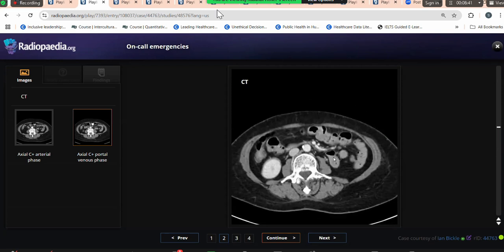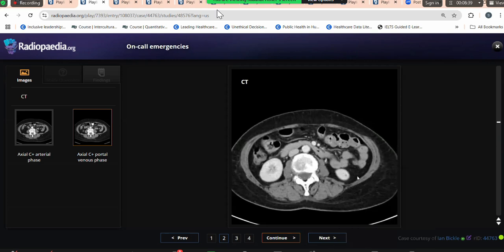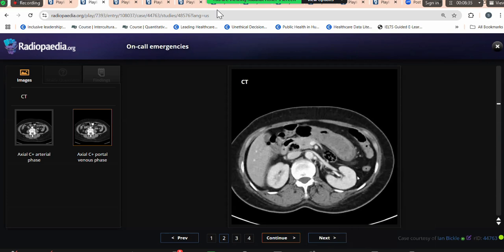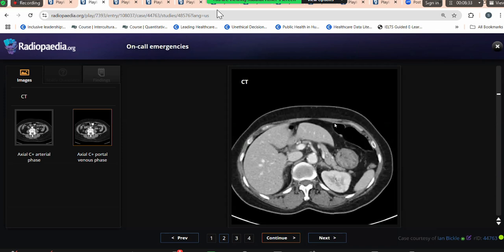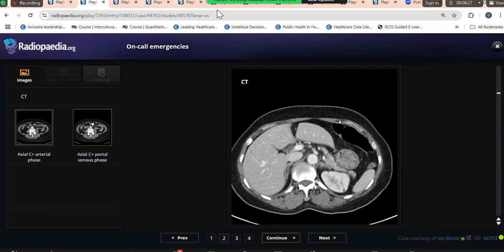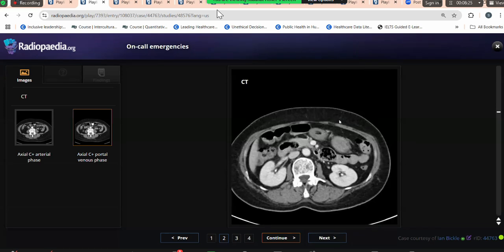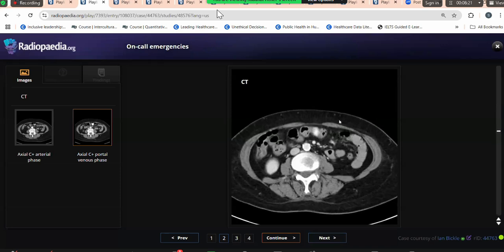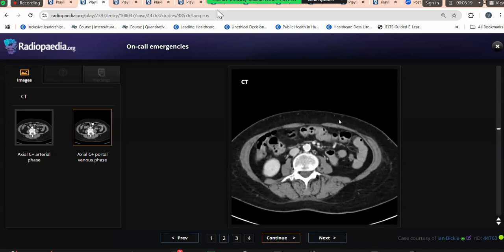But at times it might be difficult, but let me try it. So I'm still in the colon on the left side, right? And then I have come to the transverse. And at this point, I do understand that it becomes difficult to trace the colon. It somehow gets lost. So if the candidate is saying that transverse colon, I will not be very mad.